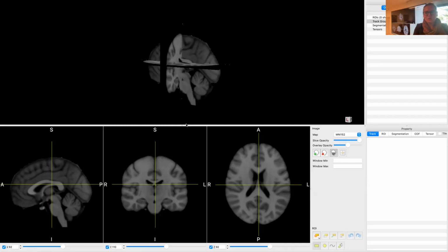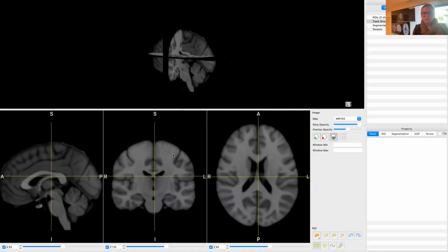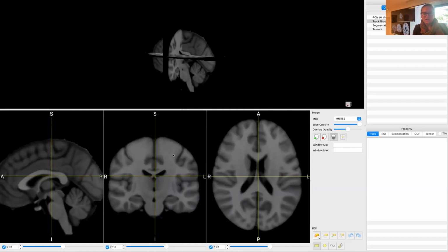I maximize that one. You can also, and this is where Mac and PC may diverge, zoom in a bit. And Shift or Control will either change the contrast in the image, or you can position it differently. So we're going to have 2 hours of dissecting a couple of tracts.